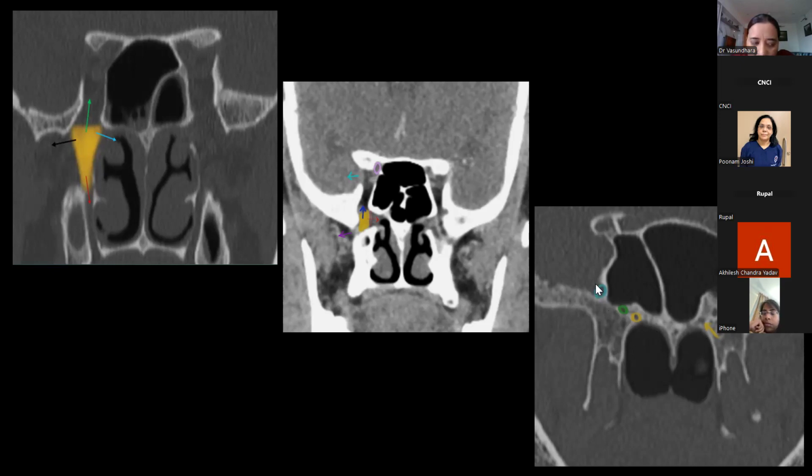So if you want to know the landmark, look at your nasal cavity, keep scrolling behind till you get this bony bar and the McDonald's M. Look at its ear, your Vidian canal will be there. Go diagonally opposite, your foramen rotundum will be there. This is another foramen, not very important. This is the palatovaginal, but it does take the perineural spread from the roof of the nasopharynx. So this is how to trace your Vidian and rotundum. Now you will find them in all your patients.